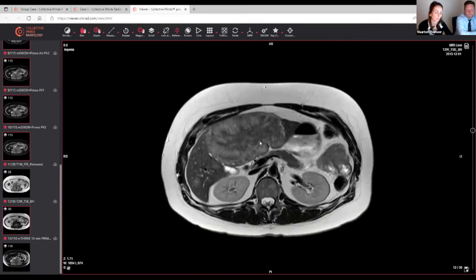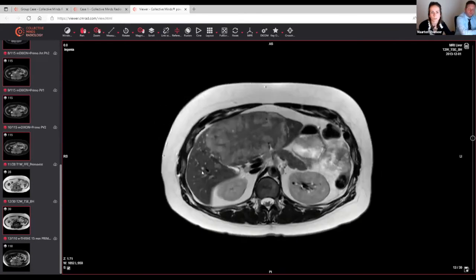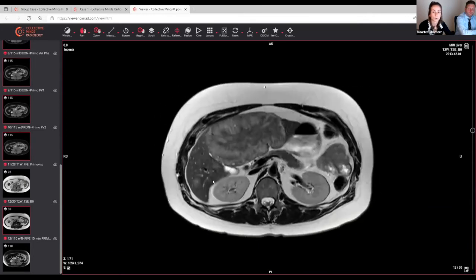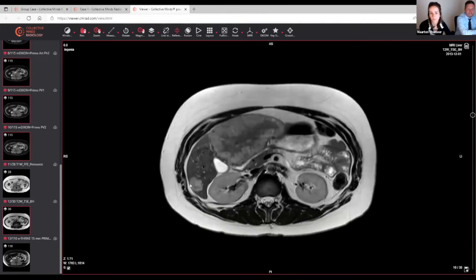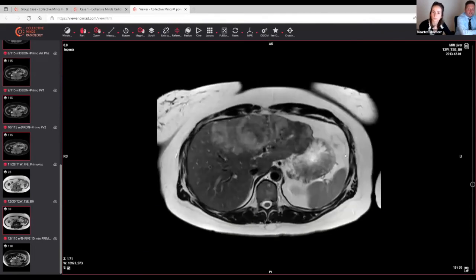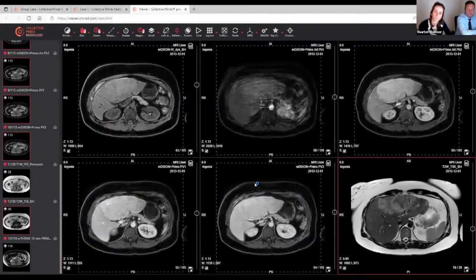Yeah, so I think that there is a pattern. Yes. Because we can see all those hyperintense areas peripheral, so like a hyperintense band, and then the center is more isointense to the liver. And the other lesions, do they have the same appearance? Yes, I think so. They are also slightly hyperintense compared to liver on T1 as well. And this is, I guess, the atoll sign. This is clearly the atoll sign. Once you've seen it, you can easily recognize it. So the hyperintensity is a kind of sinusoidal dilatation. And how would it be visible in the venous phase compared to the surrounding liver?